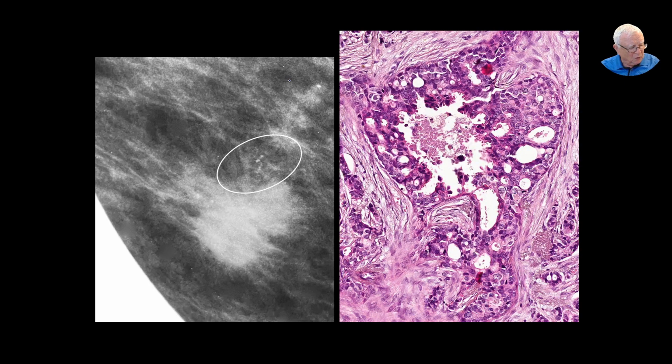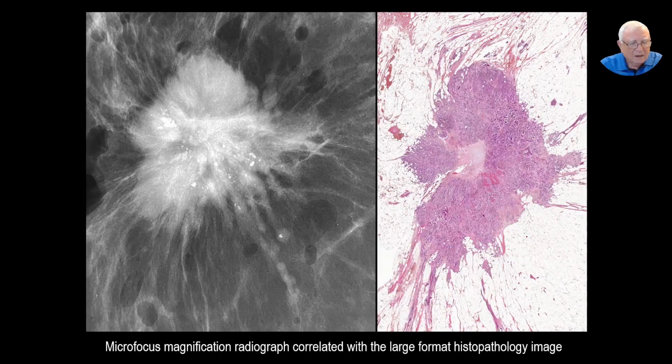You have to vote for yourself, and you would do this very simple thing. What is the structure here? That must be a duct. Or an acinus. In that case, battle is over. Very ugly cancer cells. And also, I see this.